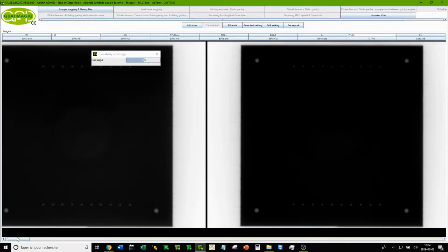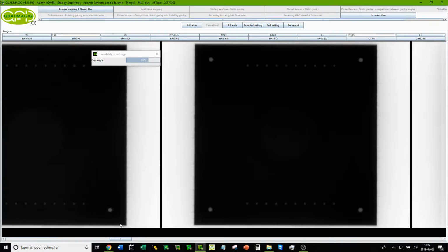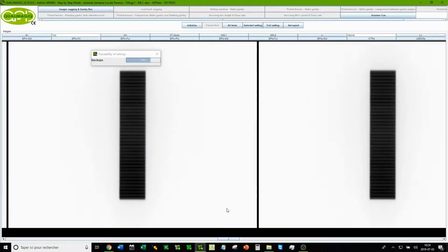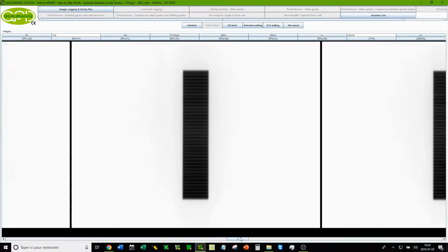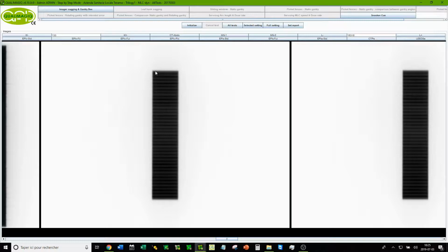To begin, I would like to describe the acquired images before we take a close look at the test. So I will not examine these first images of a pre-test, whose purpose I will explain later on, but rather will review the test images. The first test is a sliding window test, which includes a set of 4 images acquired with the 4 cardinal gantry angles: 90 degrees, 0 degrees, 270 and 180 degrees.